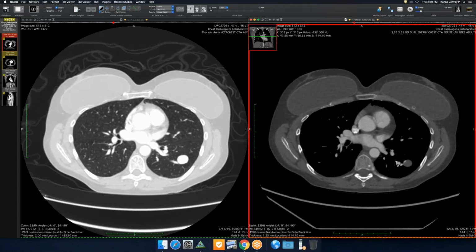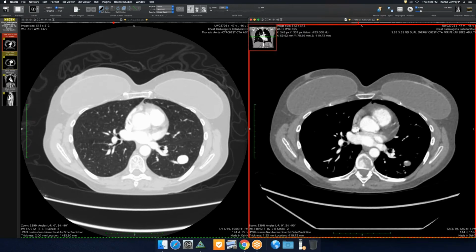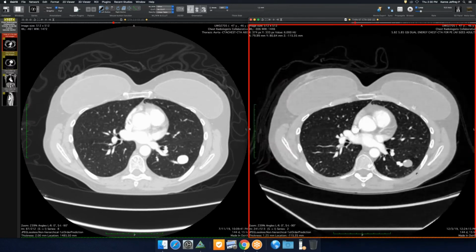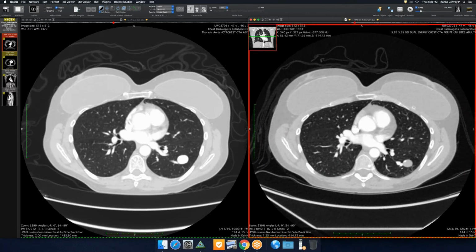And you can see it looks like it obstructs the vessel, and it mostly did its job, but you can see there were still some symptoms, and the shunt fraction wasn't back to baseline or where it should be. There's a little bit of contrast coming in here, and I think it's coming from this little branch right there into the AVM. So it's almost like an endoleak equivalent, where it's just leaking around the plug. But I've not seen one of these plugs used before.